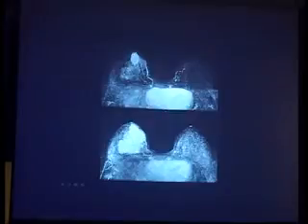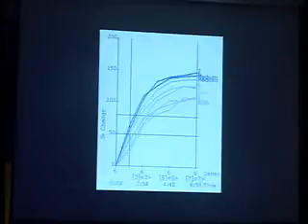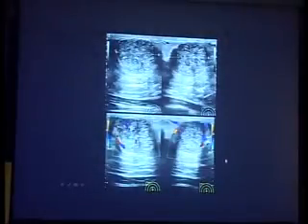So the curve, if you were to get a curve, would be more type 1, and indeed here's the curve, type 1 kind of going up. Maybe a little bit plateau, some of them, but you do not have washout. Again, just to remind us of what the curves look like. Again, more curves. Okay, this is of that particular mass. Ultrasound.